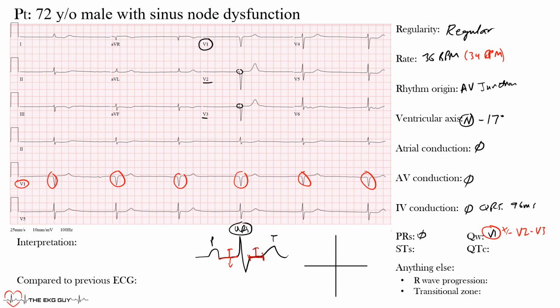Is there any elevation or depression, we're asking ourselves. In this case, there's not much ST segment elevation or depression, not something that I would certainly comment on. You see a little issue here at the end in the complexes, but nothing significant, and that isn't depression or elevation going on there. So really not much to comment on here that would be significant or stand out, at least that would change our management.